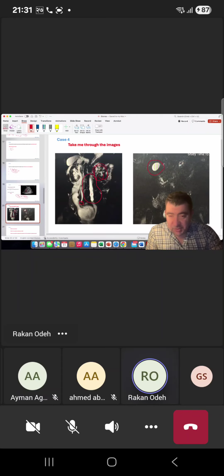But yeah, you commented on the right side. But even in the comment of this picture, there wasn't any mention of a duplicated system on the left side. However, it looks like it. I don't know. But so you commented on the right side.